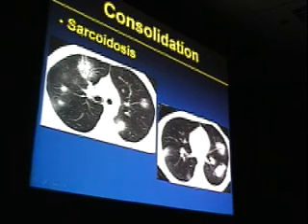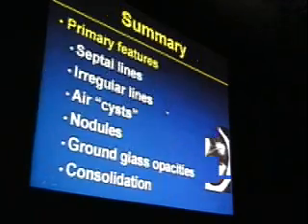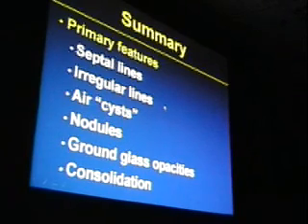They often have these feathered or spiculated margins. Air bronchogram sign is often prominent centrally, as you see here. But notice that as opposed to the patient with organizing pneumonia, you do not see that central area of ground glass attenuation. Subtle here, but better seen in mediastinal windows is fairly extensive adenopathy, another clue to the correct diagnosis. Okay, so we went over a lot of material fast.